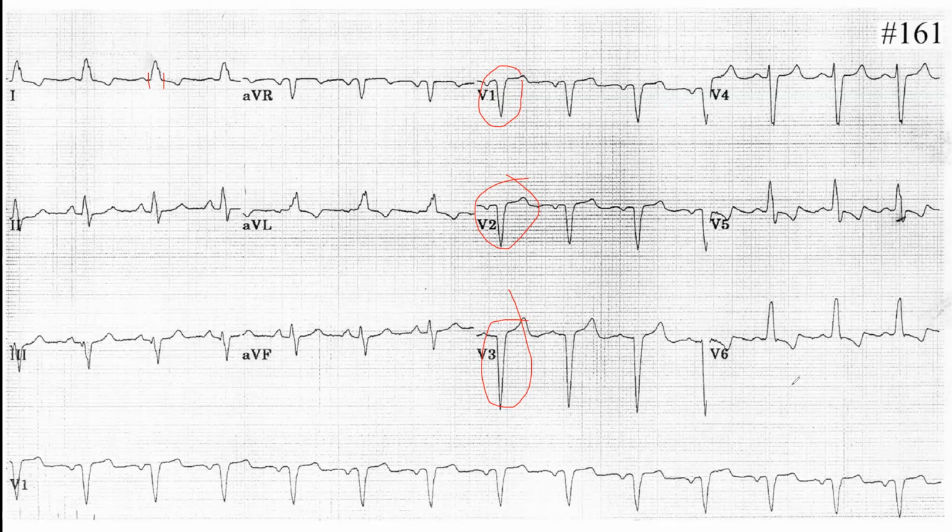This is why it's difficult to diagnose an anterior MI if we have a left bundle branch block, because left bundle branch block itself alters the first phase of the QRS complex. The right bundle branch block does not influence the first part of the QRS. If you go and watch again the conduction abnormality videos, you will see it. Please, it's very important.